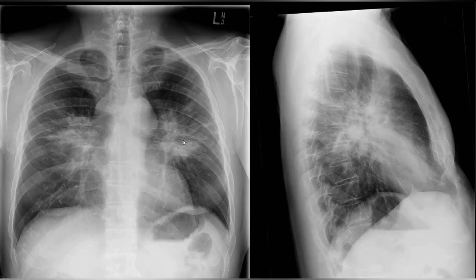Based on these findings, my differentials: these could be central perihilar opacifications. So it could be a case of non-cardiogenic pulmonary edema. So it could be perihilar consolidation. If the patient is immunocompromised, then sir, it could be Kaposi sarcoma. Kaposi is not like this. Sir, these are basically radiating opacities in the perihilar region.